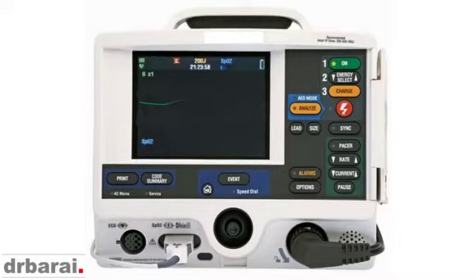Now, this is a very weird type of rhythm. We cannot see any QRS complexes. We cannot see any ECG pattern at all. However, this is not quite a straight line. This is a little up and down. And if we look at the patient, we found that this particular patient did not have any palpable pulse. The patient was unresponsive. So we declare this as an asystole. We started CPR straight away, and we also followed the ALS algorithm. We have given adrenaline every alternate cycle. Unfortunately, they did not do very well. So this is a non-shockable rhythm, asystole.